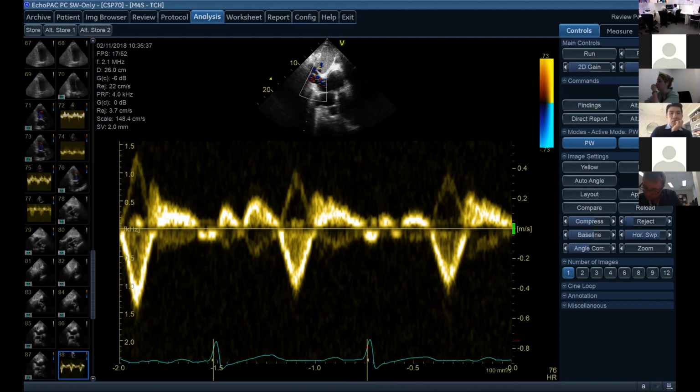Sorry, can you just clarify that? Are we looking at a more negative velocity for the diastolic? Exactly. So diastolic flow reversal. Basically it's difficulty in filling the heart because you've got the heart squished by the thick, horrible constrictive pericardium, so you can't fill the heart well. During systole it has a bit more of a chance, but during diastole it finds it tricky and you're getting flow reversal then. It's worse during expiration with constrictive pericarditis.